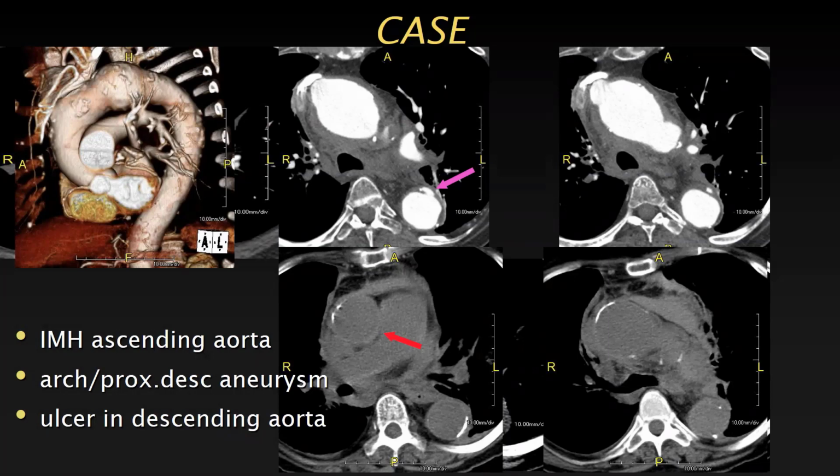The explanation for the patient's mediastinal widening on the chest X-ray is that the patient has mediastinal hematoma. Again, look at this. The hematoma is hyperdense, so you have fresh hematoma in the patient's mediastinum. So something is leaking into the mediastinum, which is usually not a good sign.